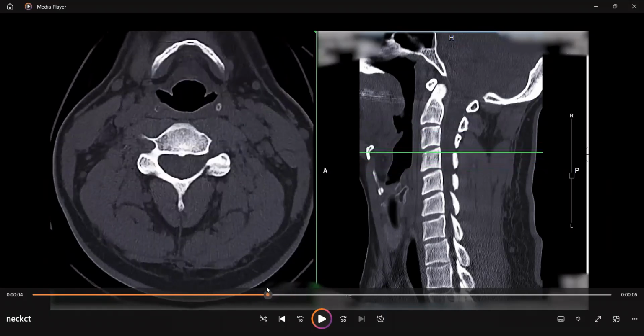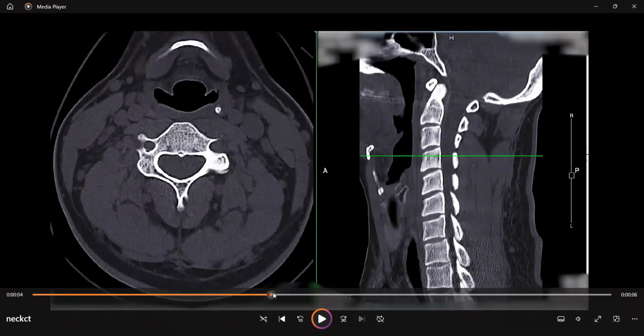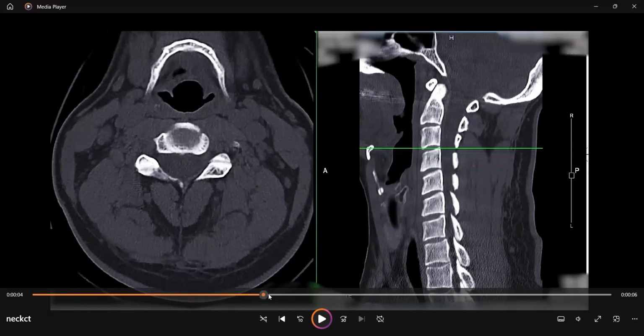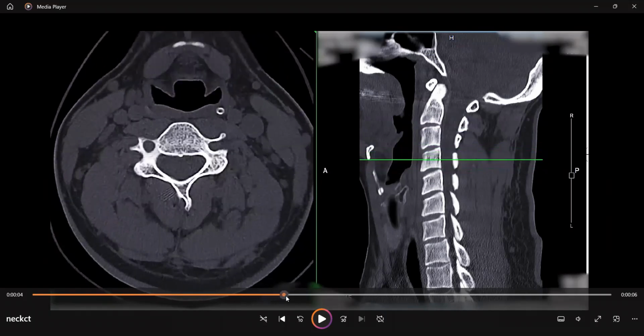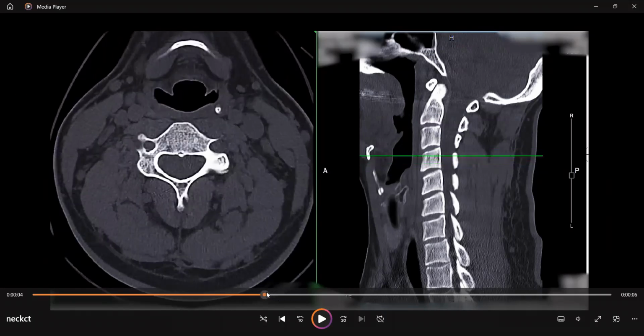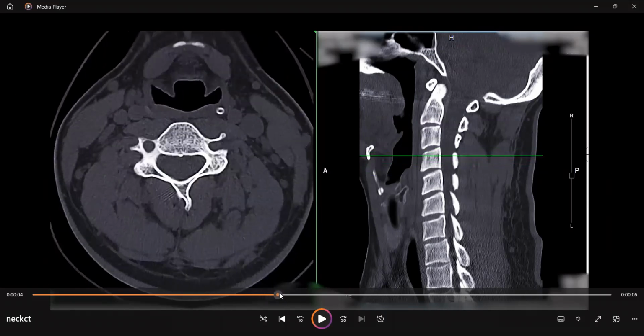And if you look at it, it should be nice and sharp. This should be nice, sharp triangles, predominantly fat filled. The fat in here should be clean. Patients who have had radiation can have some chronic edema that persists in that area. And if fluid overloaded, you can have some edema there. But in general, that should be a normal patient. That should be nominally fat filled and it should be pointed like this.